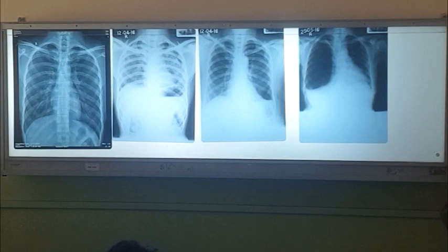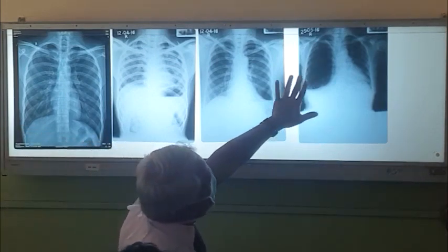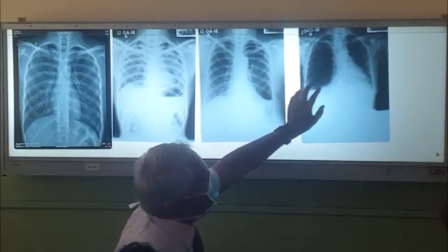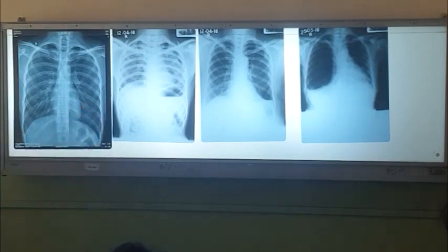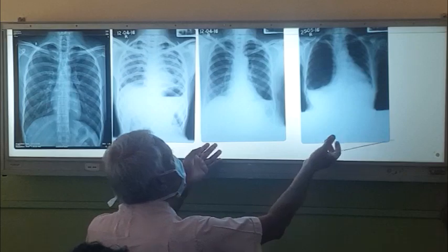But it is very important to differentiate, because if somebody thinks of pneumothorax here and put IC tube, this patient is going to die, right? You get a severe bronchopleural fistula and he is going to die, right? Whereas if it's a big pneumothorax, if you don't put IC tube, he is also going to die, right? Sometimes you may have to do CT to differentiate, right?